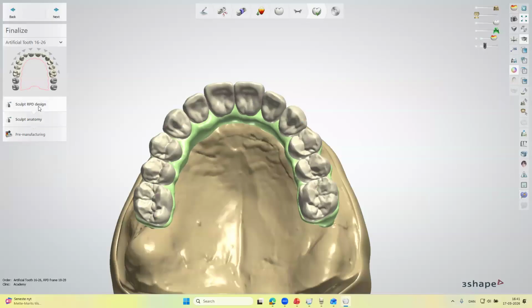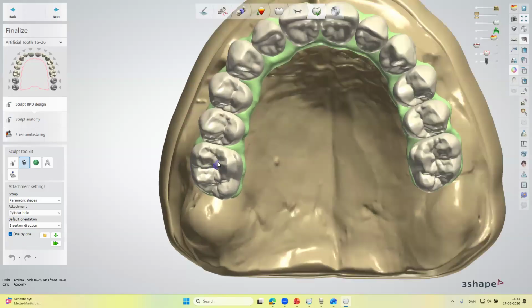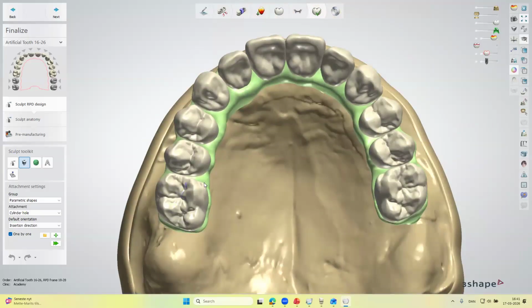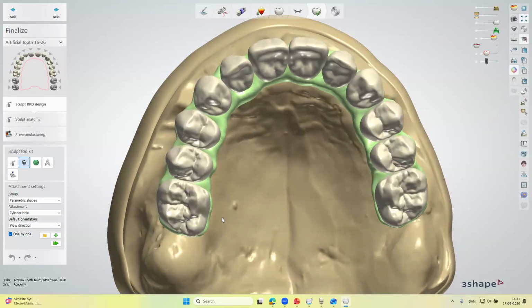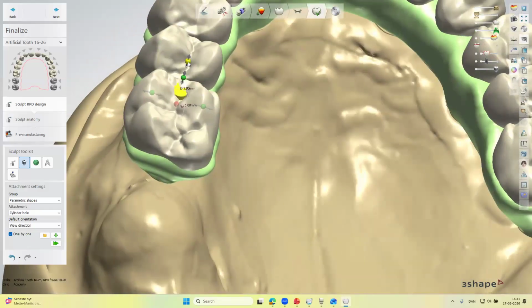use the attachment option in here with attach parametric shapes and cylinder hole. And once those additional scans will be visible in here as screw holes, I could use the parametric shapes in cylinder hole, probably from viewing direction, because then I look at the screw hole from the top and apply it in the right place. Why this element?